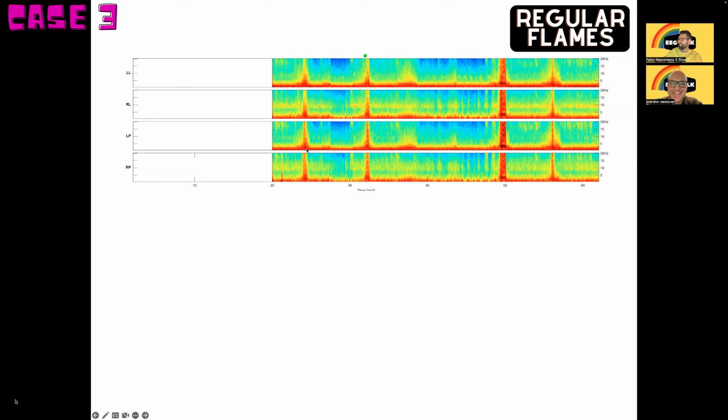Okay. And so every time we see flames that are regular, we think seizures. Yep. They're everywhere here on the 4 panels, so maybe generalized. Yeah. But not this one, right? This is too much. What about that one? Is it just artifact? That's probably artifact. Usually, because it goes across the entire spectrum, and it doesn't seem to evolve. It seems pretty abrupt. Typically, that's an artifact.